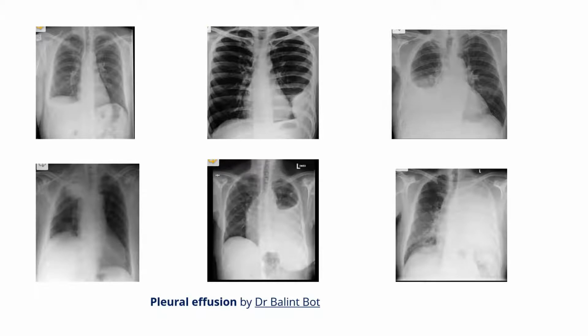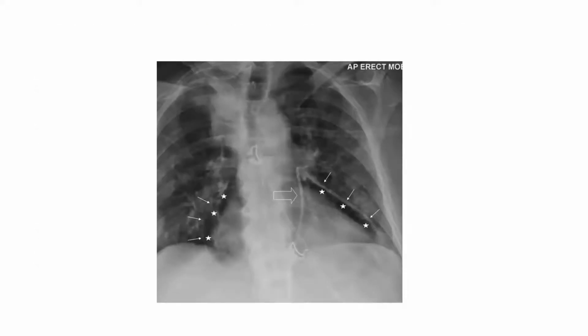So you get this point? Yes, okay. Good. Now, I need somebody to tell me what she sees in this chest X-ray. I'm going to give you a glimpse here.